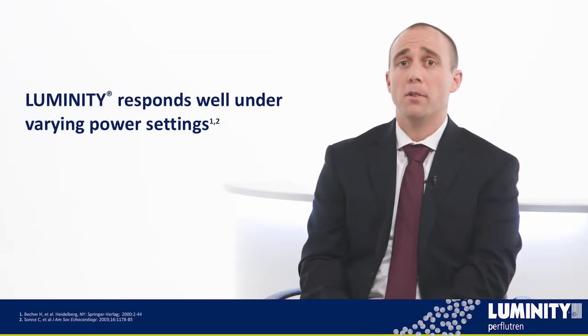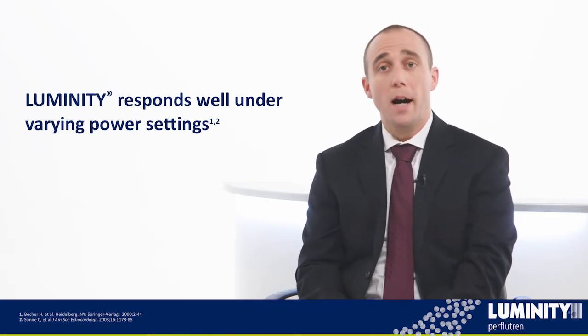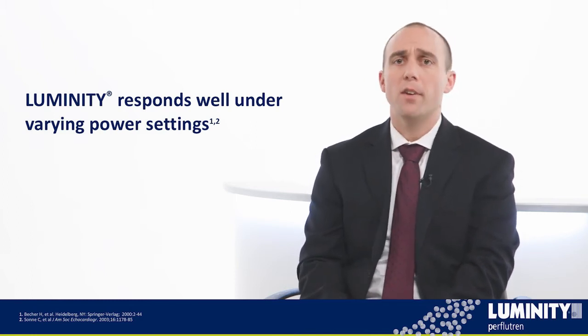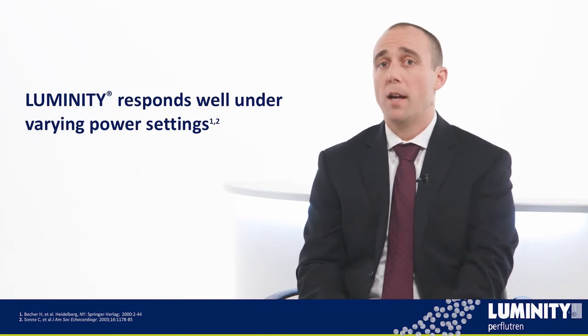The flexibility allows the Luminity microbubble to compress and respond quite well under varying power settings. The MI, or mechanical index, can be adjusted appropriately to meet the imaging needs of various patients that may require higher or lower power or MI setting. It's important to know that every patient is different and every MI threshold can be different. And that not only is the size of the patient, but also how far the sound wave has to travel, which we'll get into in a little bit.